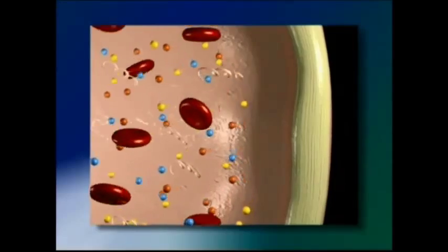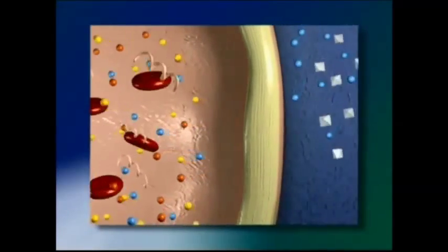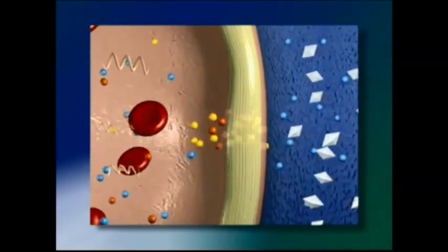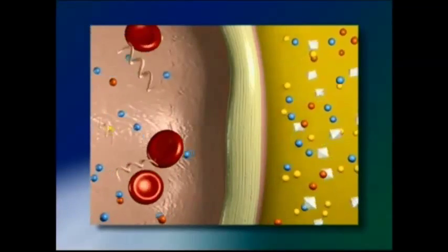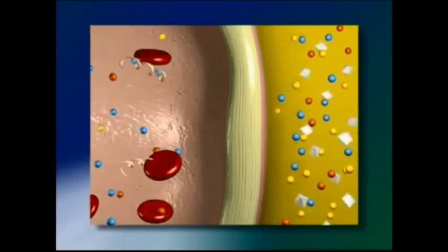During PD, the peritoneal cavity is filled with dialysis fluid. Dialysis fluid contains a high concentration of sugar so that excess water can be removed from the blood by osmosis. The dialysis fluid is left inside the peritoneum to allow dialysis to take place.